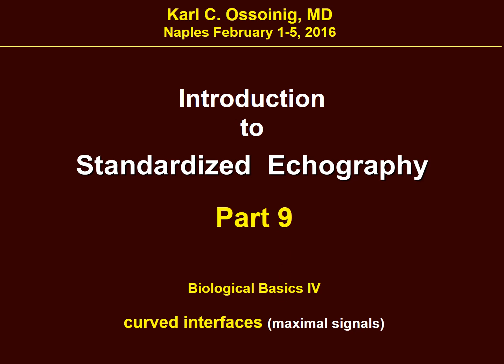In part 9 of the introduction to standardized echography, we will explain the acoustic behavior of curved interfaces and how their maximal signals look.